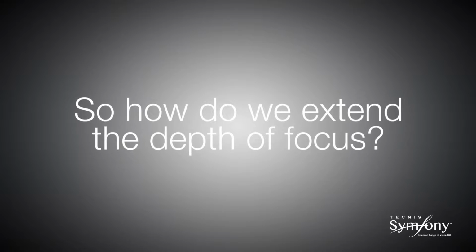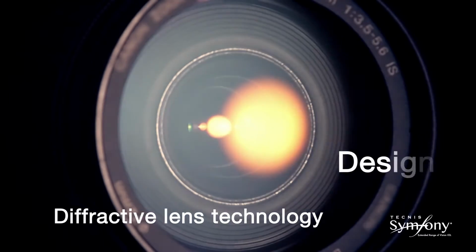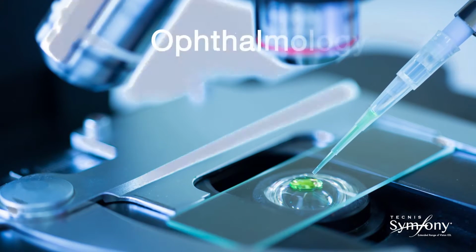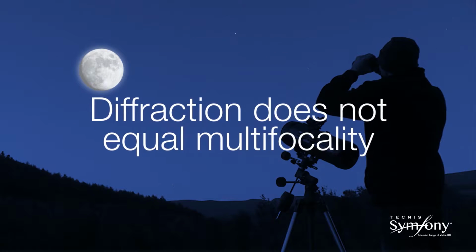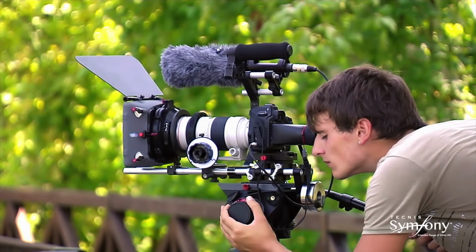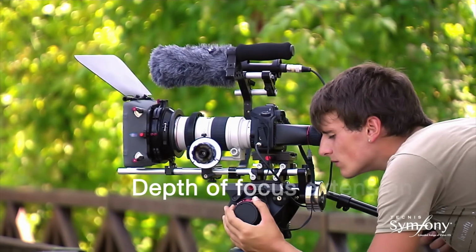Firstly, let us look at how the echelette design works to extend the depth of focus. Diffractive lens technology and design is well understood in the field of optics, having a wide range of applications, from astronomy to nanotechnology. In ophthalmology, diffractive technology is generally associated with multifocal lenses. However, in the optics world it is widely known that diffractive technology can be employed to achieve a variety of outcomes, including depth of focus extension.